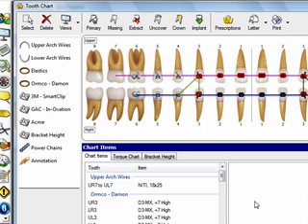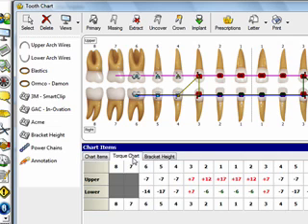tooth chart. Now this is a starting point, and from here you can change the information for each patient. For example, I'm going to go over to my torque chart, and you will set up the corresponding torque that goes with the appropriate brackets if you find torque chart or torque information important. And maybe you want to change it for this particular patient.